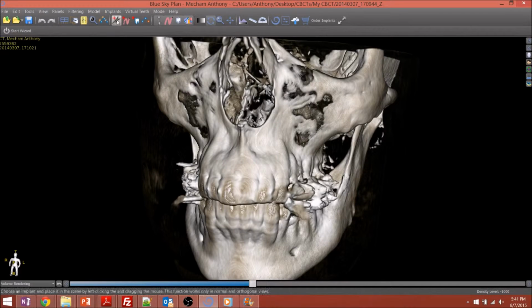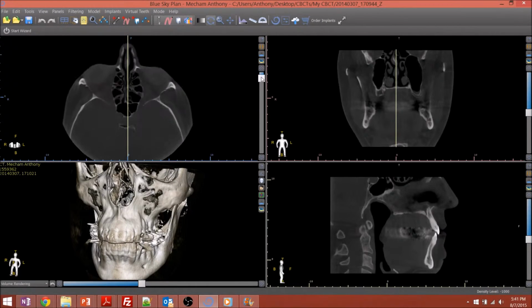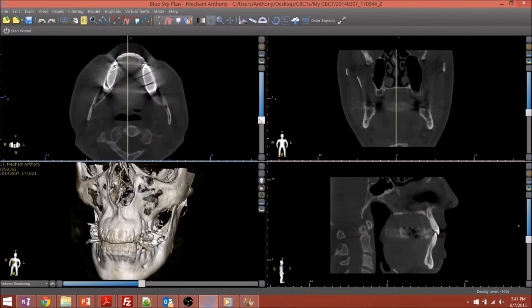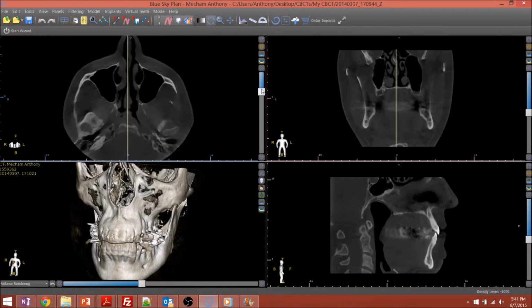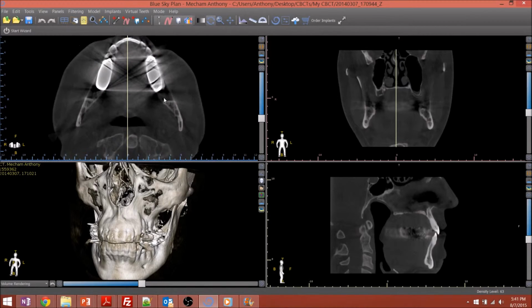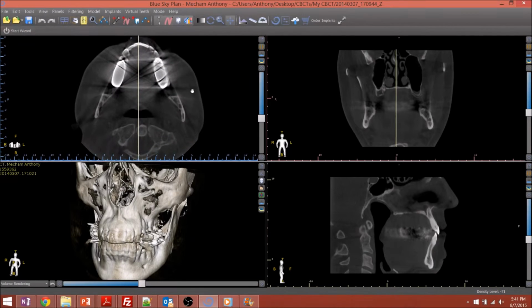So let's also look at the MPR. As radiologists, that's what we love to look at. You've got to make sure to scroll through each slice individually, and so we love the MPR. And again, I'm just in love with the way that this scrolls so smoothly. I may start using this on a daily basis. It's easy to zoom. Once you have this selected, fairly easy to move around.